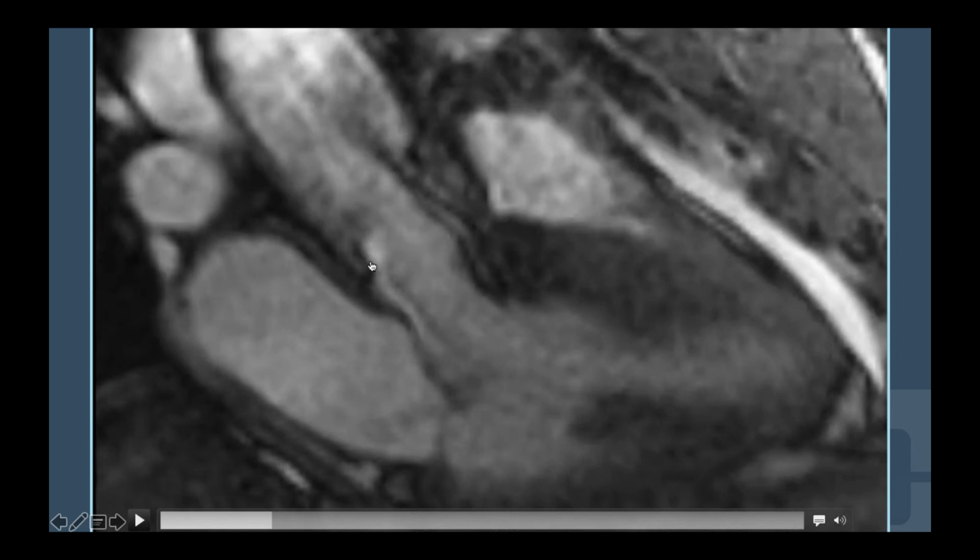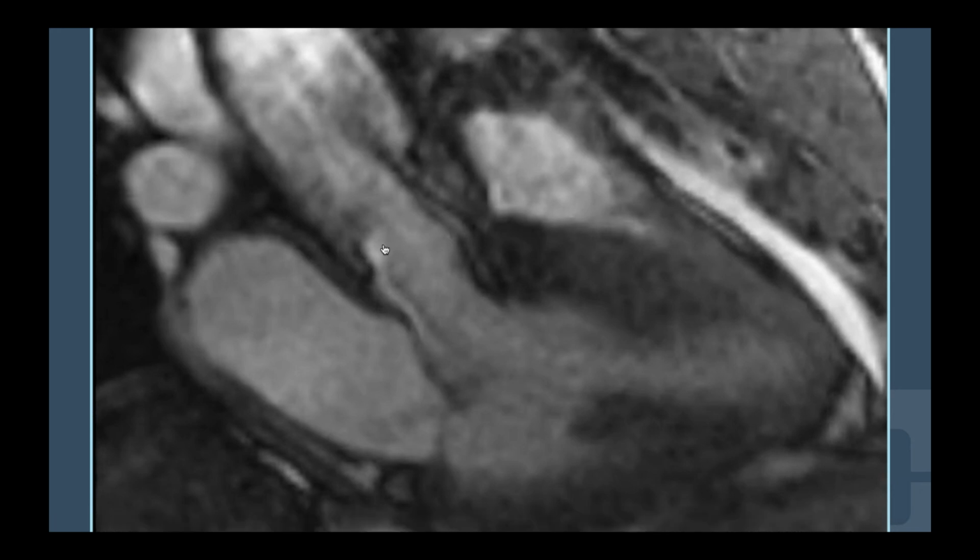That's why it got a little bit tethered and has that stair-step rather than being just one straight leaflet. So they damaged the aortic valve in this patient. This was just for further assessment. Again, this is one of the complications. It's a nice example. It's very subtle, and you have to know a little bit about it and specifically be looking for it in order to catch it.